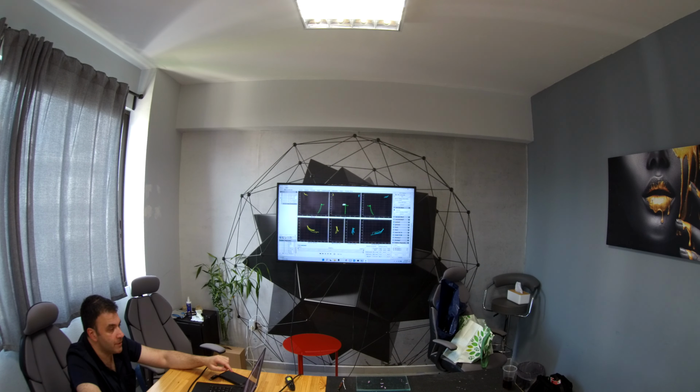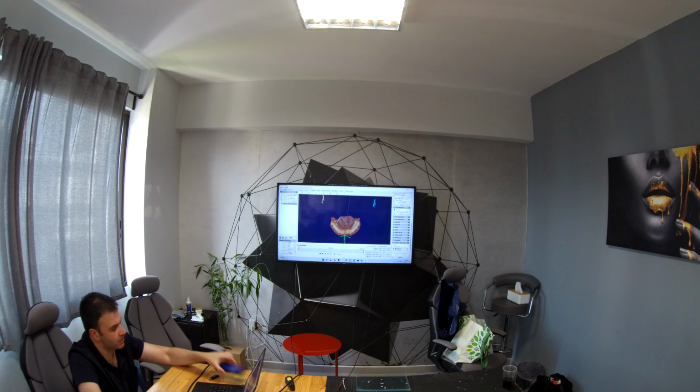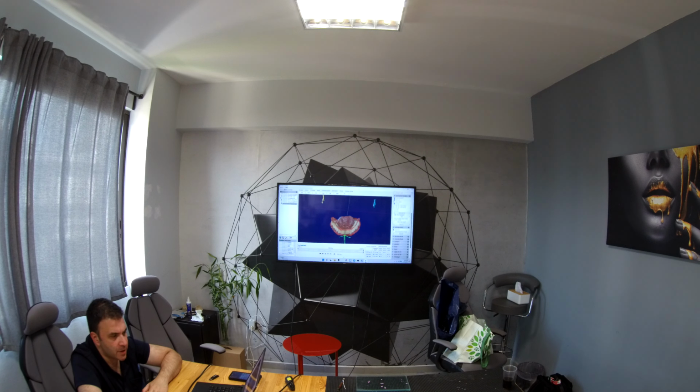So if we go to the 3D scene, we see the condyles here, and we see their upper and lower model. So if we don't have CBCT, or we don't want to use CBCT, we want to have the function. So, what first thing we do? In the models, you can choose transparent mode.